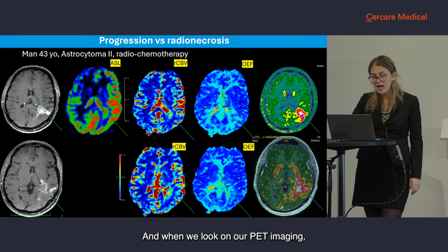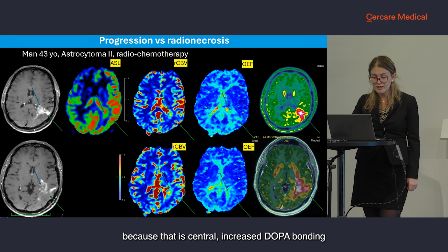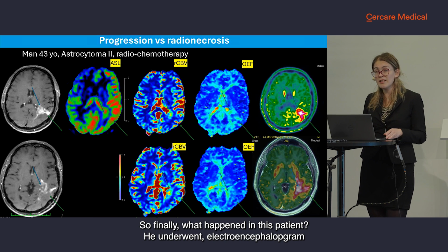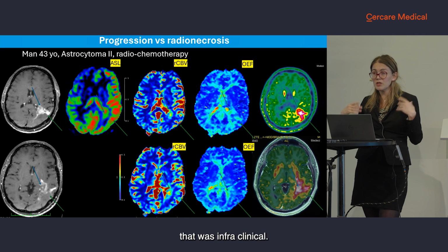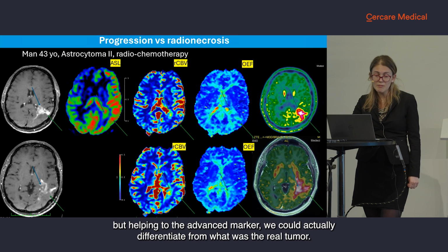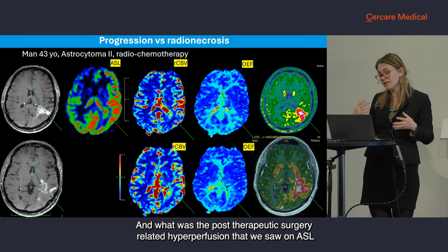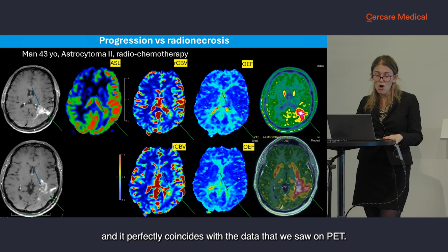When we look at our PET imaging, we see that it's quite consistent here, because there is a central increased DOPA binding, but in the periphery it's not higher than that of the striatum. So finally, what happened in this patient? He underwent an electroencephalogram, and there was a post-treatment seizure that was subclinical. All this peripheral hyperperfusion was related only to this, but with the help of the advanced markers, we could differentiate what was the real tumor and what was the post-therapeutic and seizure-related hyperperfusion that we saw in ASL, and it perfectly coincides with the data that we saw on PET.